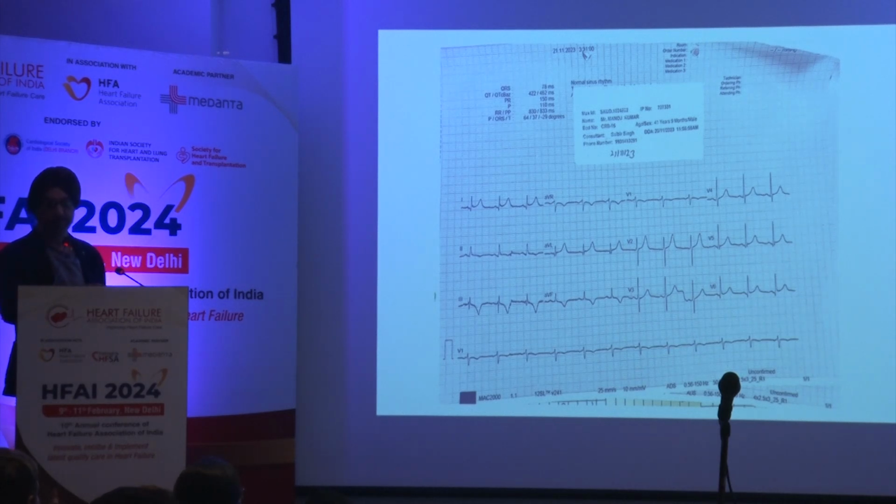So none of them, you think it's normal or it's abnormal? So how many of you think normal? This is normal. Yeah, very nice. So this is very good.